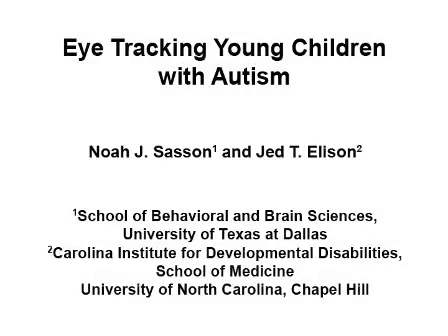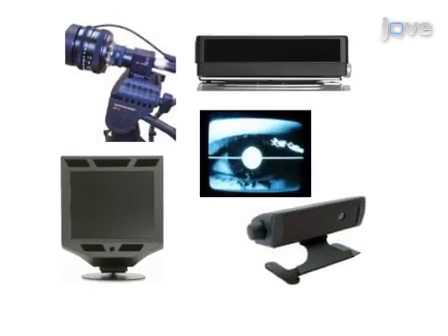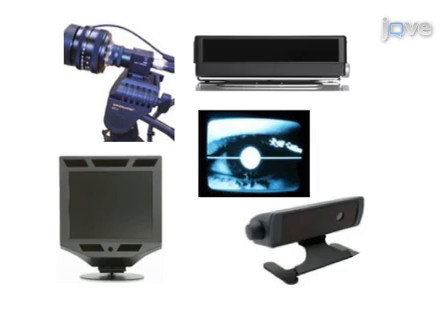The goal of the following protocol is to provide methodological recommendations that optimize research design, data acquisition, and psychometric analysis for eye tracking young children with autism spectrum disorders or other developmental disabilities. This is achieved by first selecting appropriate eye tracking equipment and creating a suitable testing environment that mitigates the complications that accompany eye tracking young children with autism.